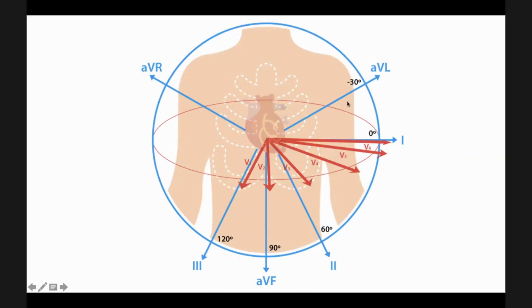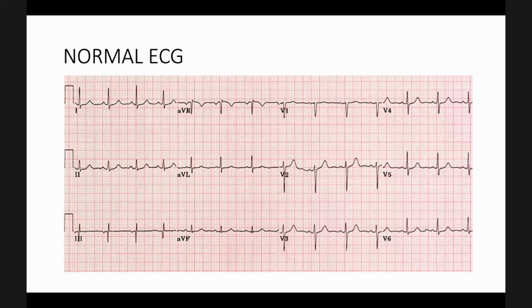You all have to read this more, because I cannot tell everything. So this is the normal ECG.